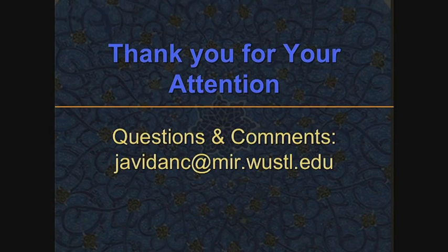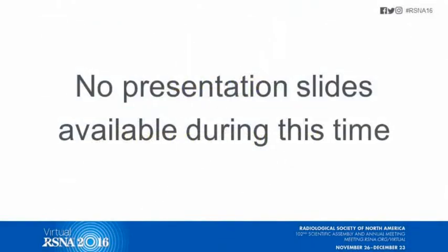This one actually turns out to be there. And the more vertical one is along the axis of the aorta. If we go back to this axial image, now we can see the sinuses look equal in size. If we didn't do that, then because of the tilt, it makes it look awkward. And that's how I usually start when I'm looking for coronary arteries. Sometimes when we double oblique things, it could make it so distorted that it's hard to tell which sinus is which.